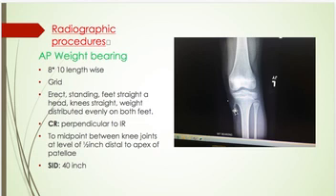Technique used for osteochondroma: increase the technique. Most commonly, it involves the lower femur or upper tibia. As you see here in our case, the proximal tibia, and it is capped by growing cartilage attached to the skeleton by a bony stem. But it can occur in any bone in which endochondral ossification occurs.